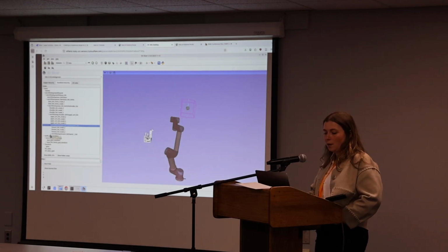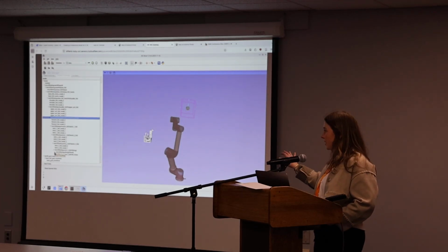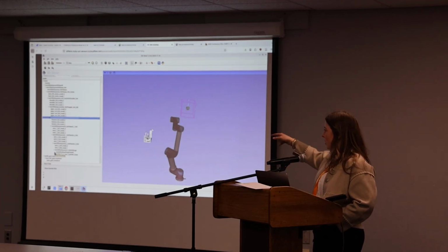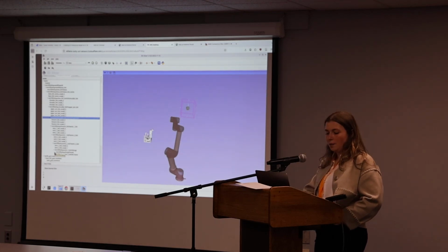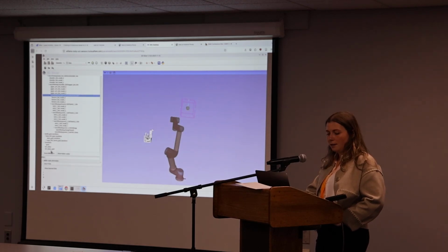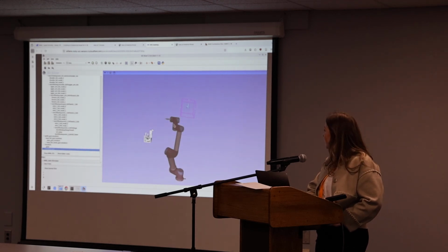So you want to extend the whole transform tree. And as you're doing that, you can see all the models that sit at each tree. So each of these is a TF transform. You can see ROS2, TF2 lookup, and then it says what it's between. So link to wrist, all of that. You want to go right to the end. And we're going to scroll down and take this UR stylus and drag it onto, I think it's link to flange. And you should see a spike show up on the robot.